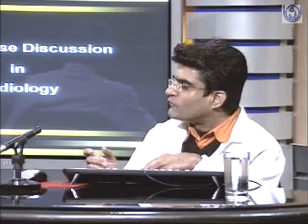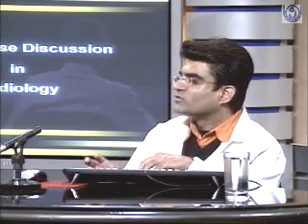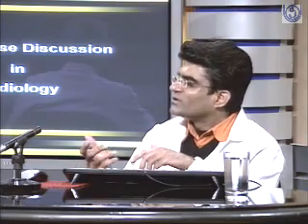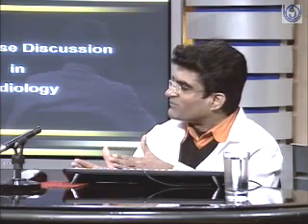When you are doing a barium swallow, your main focus of interest could be only on the opacified contrast column, because it gives you a better resolution in black and white. So your main interest will be on the pathology per se. But a preliminary investigation like a plain chest radiograph will help you to say whether there are any complications pertaining to pneumonitis, consolidation, effusion. So always try to do a plain X-ray.